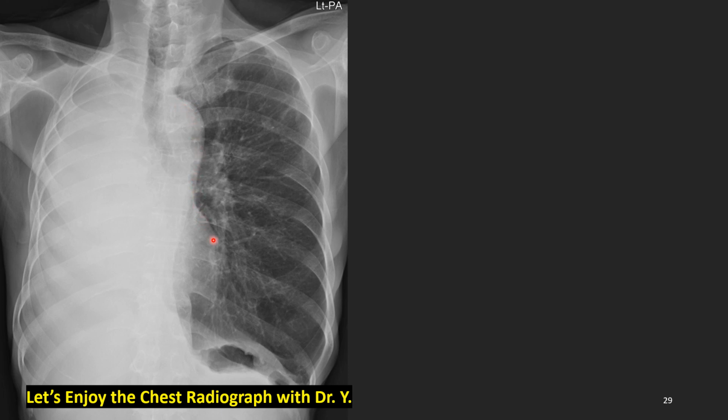Mediastinal structure is shifted to the right, trachea is to the right, left lung is hyperinflated, and we don't see the right main bronchus. That may be from tumor up to carina level. Right total collapse.